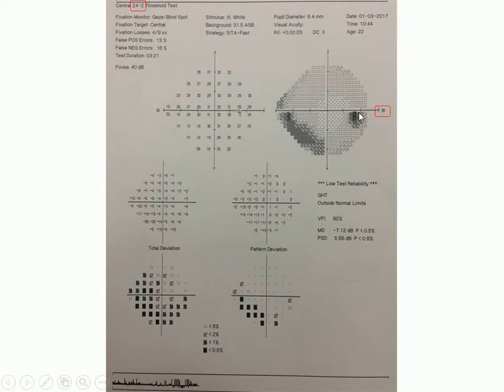And this direction here would be towards their ear. This would be visual stimuli coming from their right side towards their ear, their temporal side. And we see again as we go up, 10, 20, about 24 degrees, because this would be 30 degrees. But here on the nasal side, we have 10, 20, 30 degrees. Here the visual testing is done all the way out to 30 degrees.